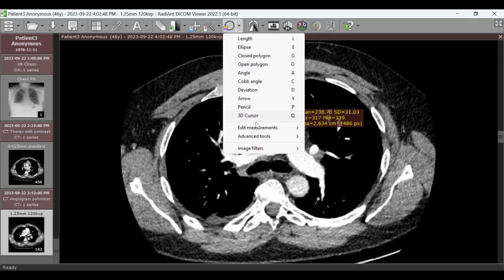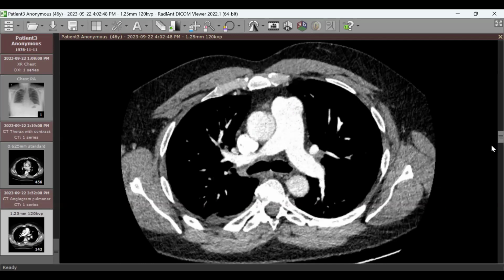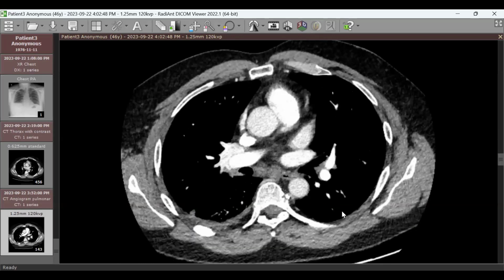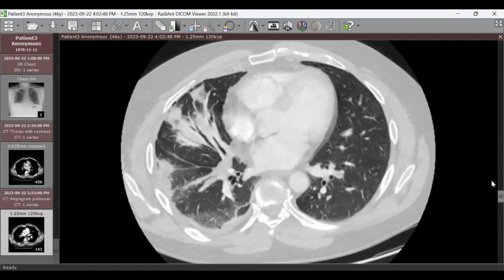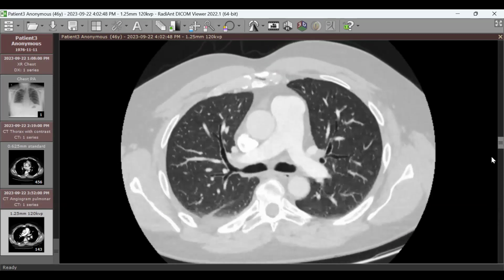The other thing is the measurement of its diameter, which should be below the aorta, meaning the aorta is larger. Yes, this is for right heart strain. But before that, for the technique, we check the density in the pulmonary artery. Also, we check for any respiratory artifact that could obscure the visibility.